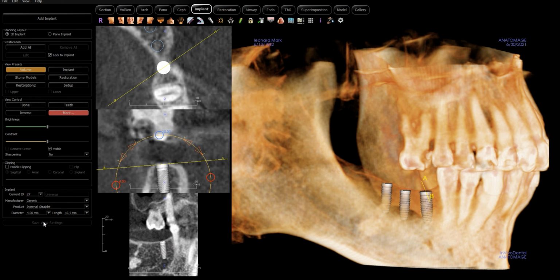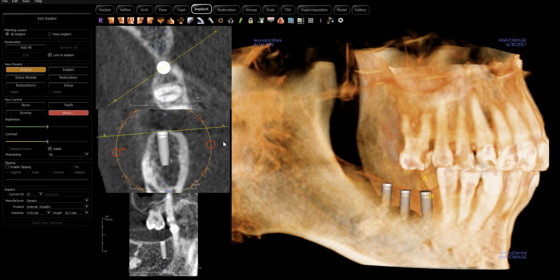All right, so let's just say 4mm. Do we have good cancellous bone around the implant? Yes. Again, this is a very rare ridge. You're very much fortunate with this particular patient. It's not always the case. So let's just say we go with a 4mm implant plus or minus 0.5, probably more on the 4.5 side than 3.5. As we get into the 3.5 and the 3.0mm implants, we start to talk about implants that are structurally less favorable. You're more likely to get fractures with those implants.